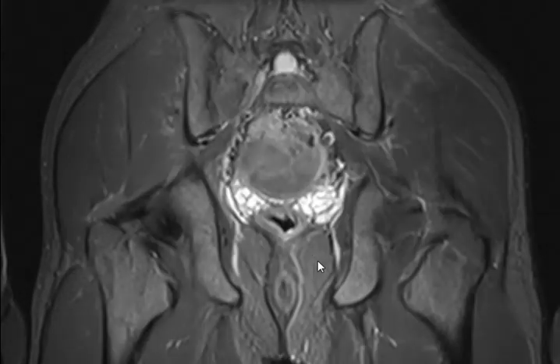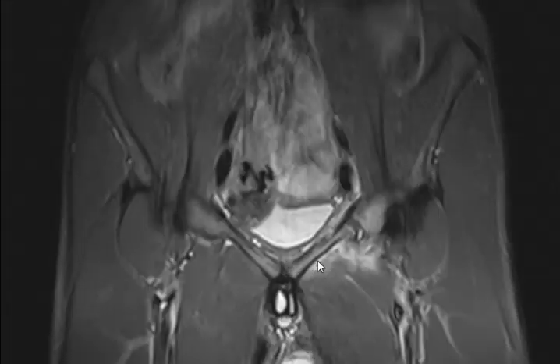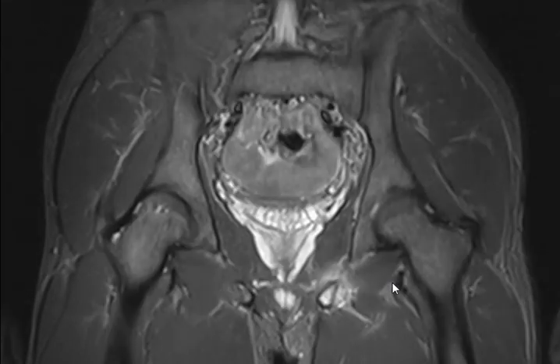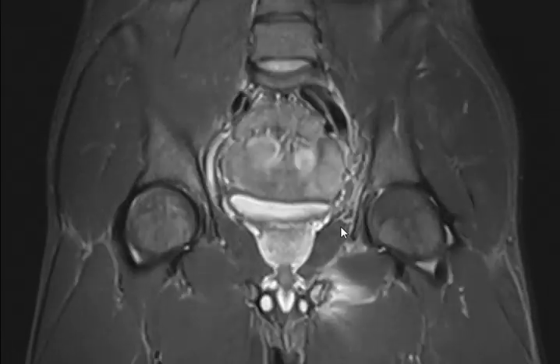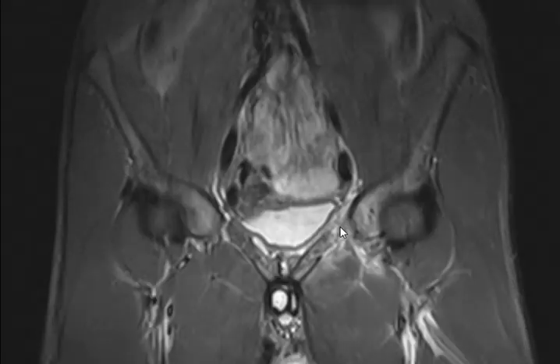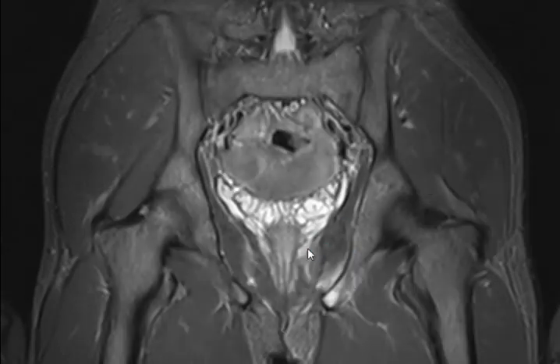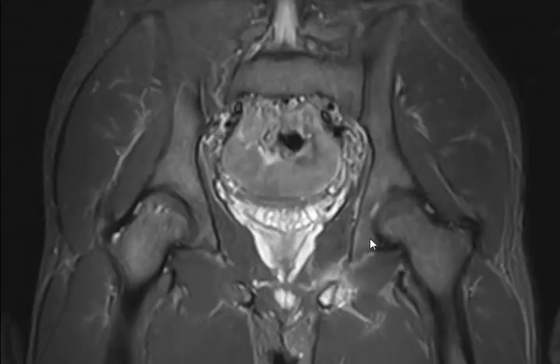Because we had an old MRI. It's 2 days, 1 day before I saw it. It's on the 25th of September. It's very new. I mean, it's not in your center. No, no. I didn't repeat the whole thing, just re-reporting. Second opinion. And to help you, left-sided hip pain. Yeah. And extra help. Okay. This is coronal T2 fat sat.